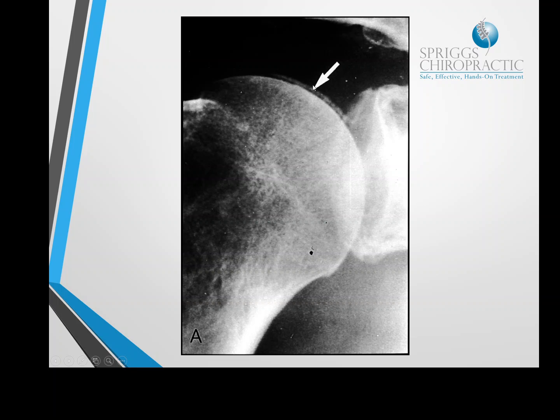Again, ignoring the helpful arrow, here is obviously calcium being deposited on the cartilage around the head of the humerus in the glenohumeral joint just here as well, so it's quite a subtle sign, easily missed. Again, on some x-rays, if you've got a patient with persistent shoulder pain, you take an image and you can't see that there's much in the way of degenerative changes.